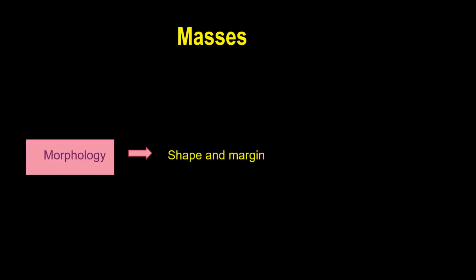Because fat necrosis is a mimicker, one of the common mimickers of breast cancer.